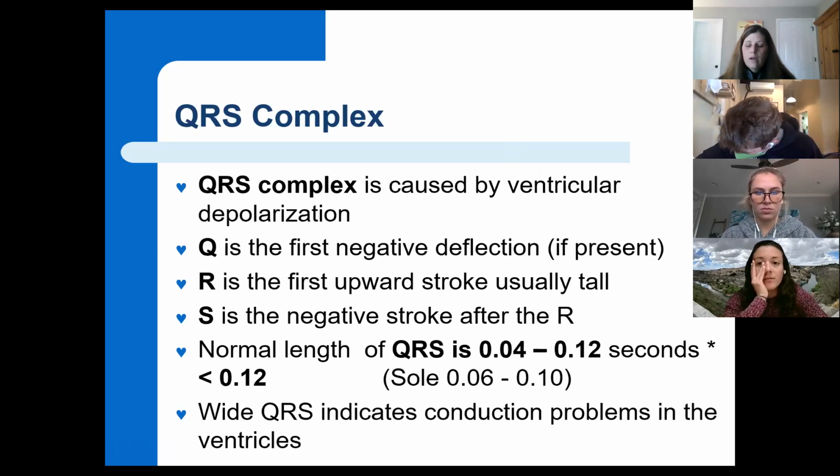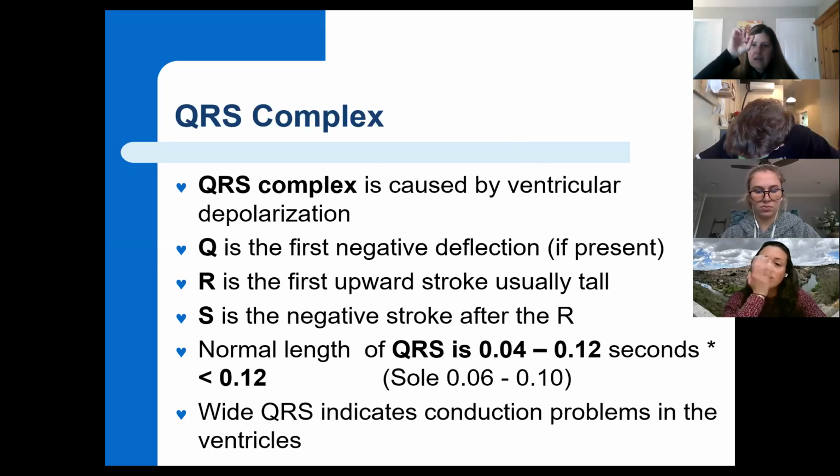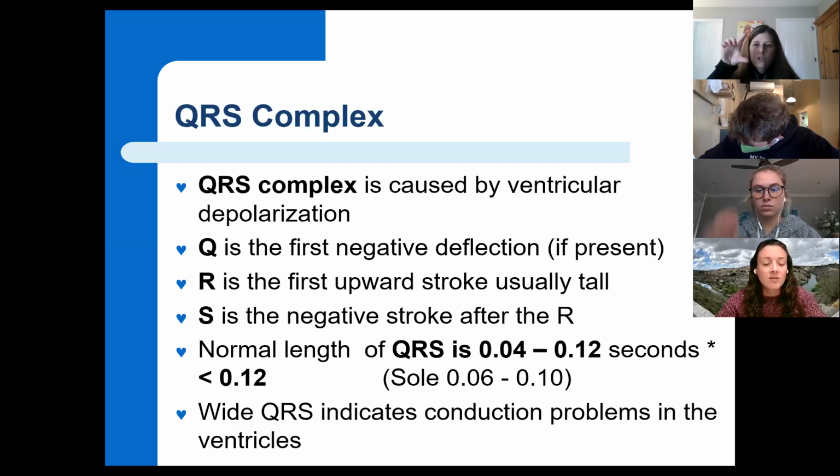If there is a Q wave present, sometimes it's not as clear as that example I showed you. Sometimes all you see is the isoelectric line and then it goes up and down. It just looks like a witch's hat and it doesn't have that first little negative deflection. But if a Q is present, it will be less than 0.04, less than one small square, in duration. And it's going to be about, Jenna, this is to your question earlier, about 1/3 of the total voltage of the whole QRS complex. It's going to be very small compared to the whole overall.